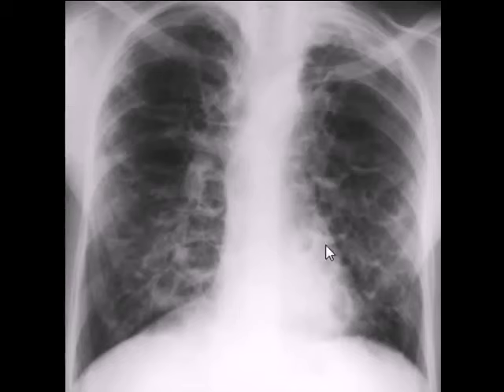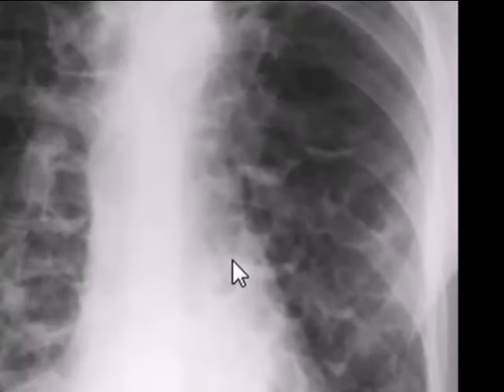So what you're seeing here is a thick crescent line is actually thick pus which is falling towards the inferior border of the dilated bronchi, which is like a cyst in shape. In other cysts, where the fluid may be a bit watery, you can see air fluid levels.